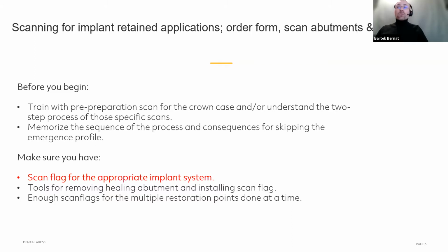And also the tool to remove the healing abutment, if it's anything special, and for installing the scan flag, which is normally just a very, very tiny screwdriver, like this one, which is barely visible. Also make sure, if you're doing multiple restoration points, that you have enough scan flags. Of course, it's possible to just use one and move it from place to place, but it is more convenient to have the appropriate amount of them.